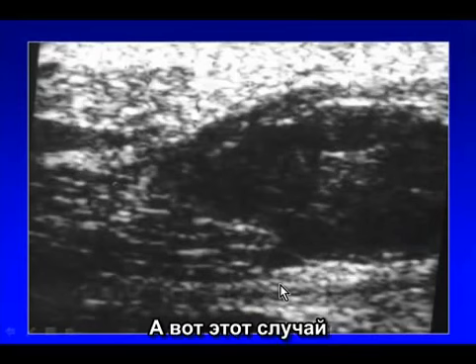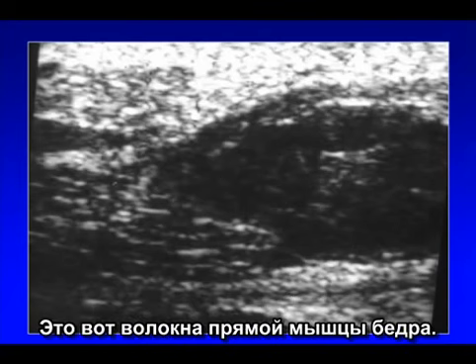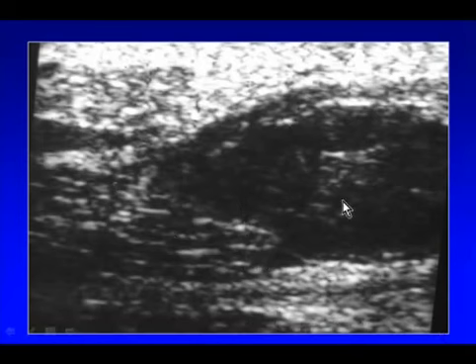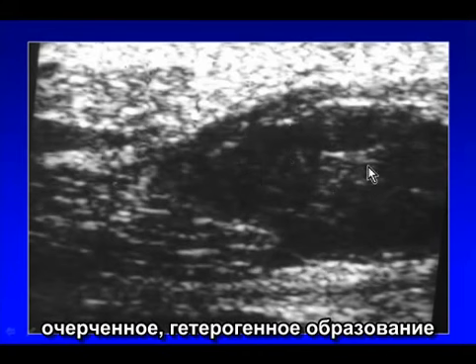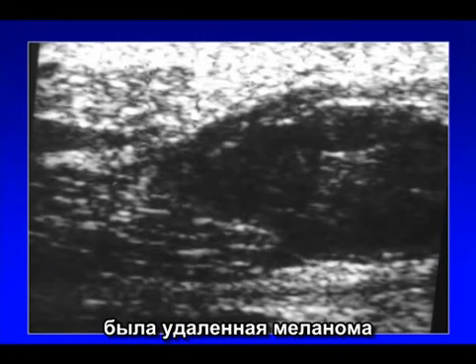Now, this is a case which taught me a lot about imaging of muscles and also about imaging tumors in general. This was a patient whose chief complaint was he had pulling in his quadriceps muscle when he contracted his leg. These are the fibers of the rectus femoris muscle, and they came out into this very amorphous, very poorly defined, heterogeneous mass within the quadriceps muscle. Now, this could be the presentation of a primary sarcoma, but it turns out that the patient had a history of melanoma taken out from the same extremity a couple years ago. So we were very suspicious this could be a metastasis.